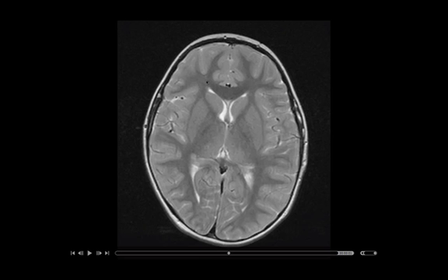So next I'm going to talk about the basal ganglia and point them out. Here we have the head of the caudate nucleus, and then we have the lentiform nucleus. These two structures make up the basal ganglia. And I want to point out to you that the basal ganglia are gray matter. Look at the shade here. It matches over here, the gyri. So that is the gray matter.